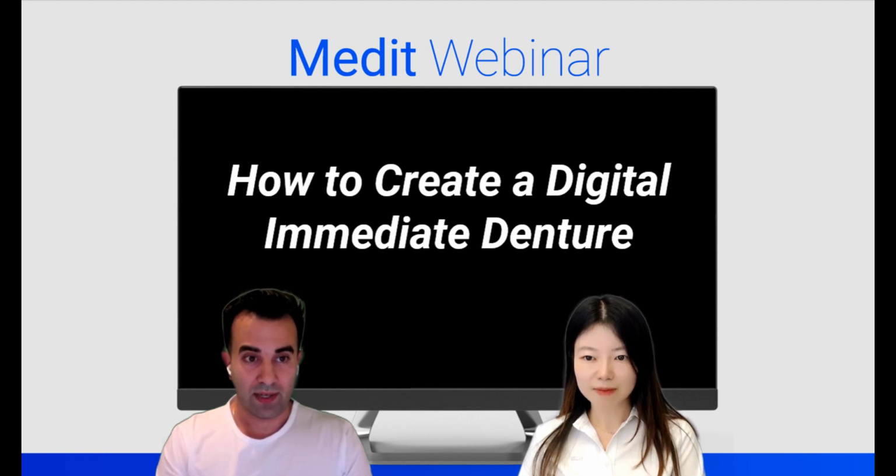Once we have the sketch and the plan for where every tooth should be, we move to the Medit Design app. That's what I'm trying to demonstrate today: how can we use the Medit Design app to make a full denture and to do the digital extraction? It's a very simple and useful trick that can be used by anyone who's watching us.